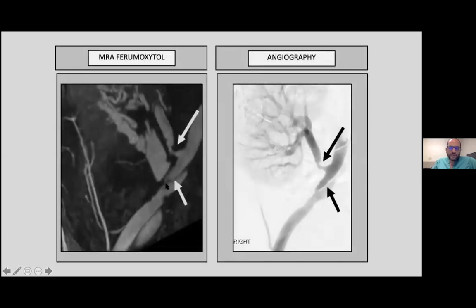It's also useful for looking at other vascular anomalies. It's not uncommon that people will have dissection flaps, since there's a lot of manipulation that goes on when they're placing the transplanted renal artery. So this is a patient who had a stenosis, but ended up having a dissection flap within the external iliac artery. So the interventional radiologist knew to come from the contralateral side when trying to fix the stenosis, and then ended up fixing the dissection flap as well.